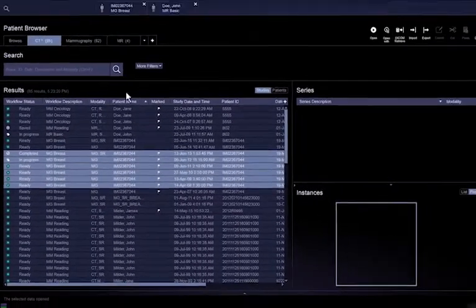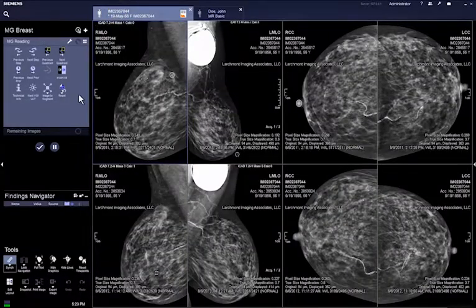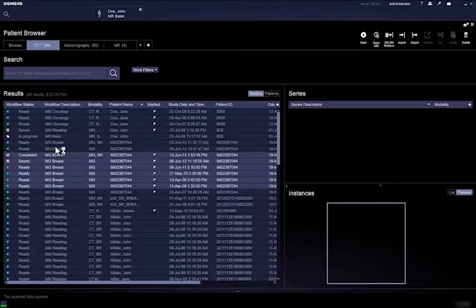For completing a case, you can choose either the button for saving the findings and results and sending them to the remote archive, or just save them locally only in Syngo VIA. This is useful for continuing with the case evaluation at a later time point.